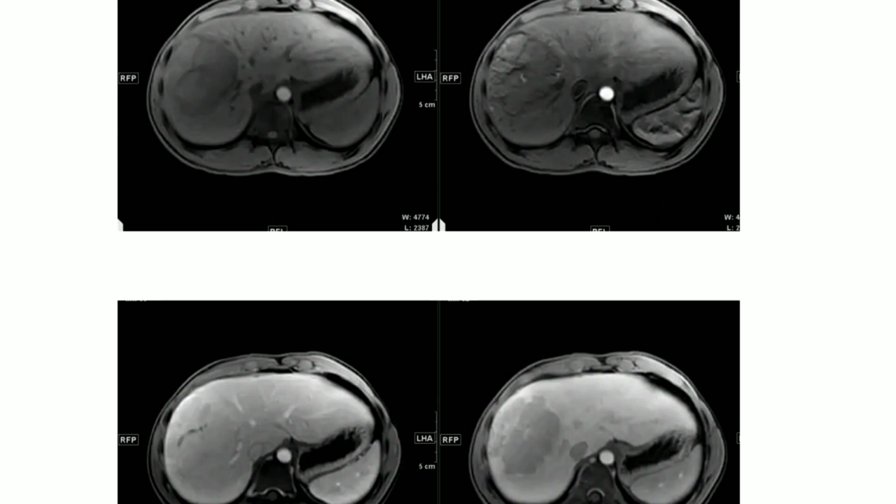So as we mentioned, we have the scar to assess. We have the homogeneity of enhancement, if it's homogeneous or heterogeneous. We have the signal intensity on T2 and T1, if it's heterogeneous, very bright, or if it's iso to slightly bright. We have washout. And if we are not sure if the lesion is showing mixed features of these, then we can always rely on Primovist.